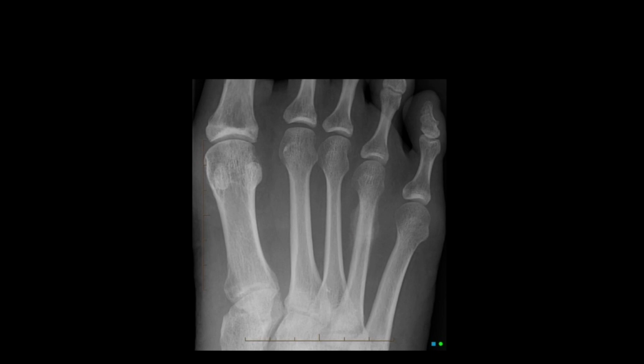That brings us to the end of the session. Thank you very much for listening and staying with us for the duration of it. I know it's been quite long. Hopefully it will be useful, and the take-home message with all of this is to be systematic, to make sure you go through each aspect of the x-rays, most of the cases with lower limb x-rays. The bones are your main concern. Make sure you check the alignment, all the aspects we described about the different bones and their borders, and any changes or breakages to those, and any changes to the soft tissues.